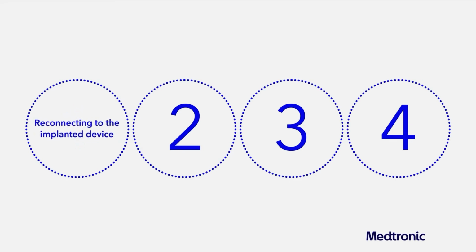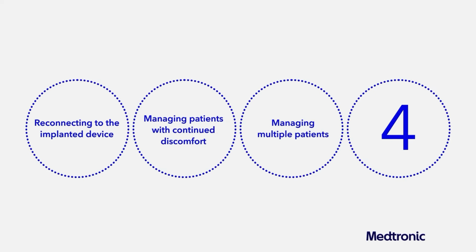First, you'll learn what to do if you experience difficulties reconnecting to the implanted device. Next, you'll learn the steps to take if a patient experiences continued discomfort after MRI SureScan mode is turned on. Third, you'll explore how to manage sessions with multiple patients on the MRI Access application. Last, you'll look at what to do when you get a Do Not Scan message on the MRI Access application.